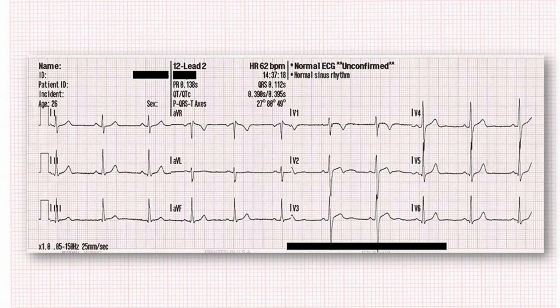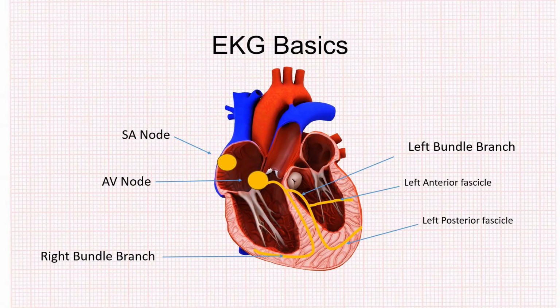This is a normal sinus rhythm EKG, but we're going to be able to articulate by the end of this video exactly what's so normal about it in a speedy process where you can sound like you really know what you're talking about. So initially, we're going to have to do some background about EKGs, about cardiac impulse formation, just to understand some of the nomenclature that goes along with it. Believe me, it'll be brief, and then we'll focus on interpretation skills.